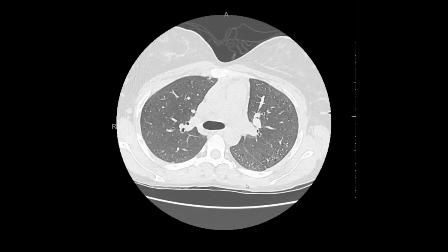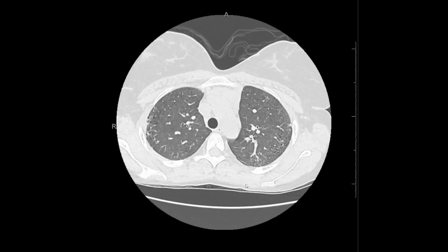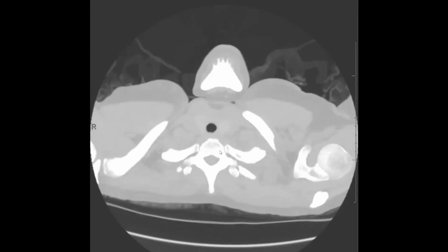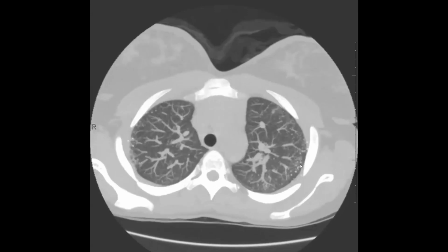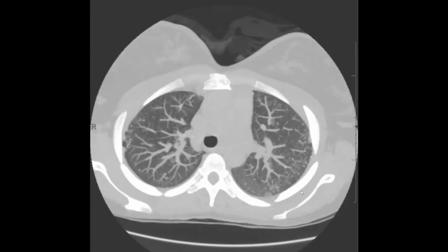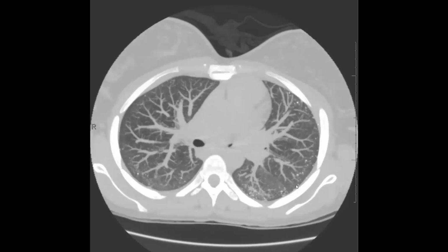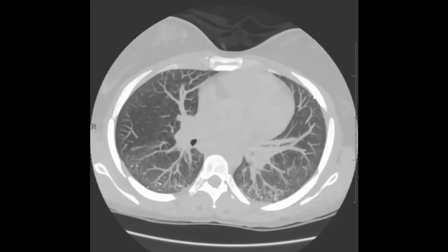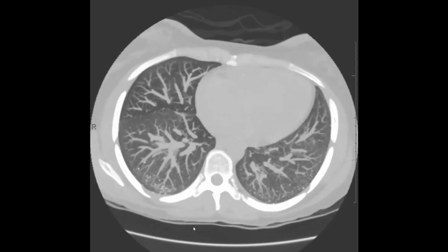Now, there was a paper published in Radiology that talked about dendriform pulmonary ossification. And I'll tell you, there is a lot of pulmonary ossification in this patient. So all these little calcified lesions, you might be tempted to just call them granulomas, but there's just way too many of them. And these calcified or ossified nodules, they're only occurring where the patient has interstitial lung disease. So that makes no sense whatsoever to just attribute this to granulomatous lung disease.